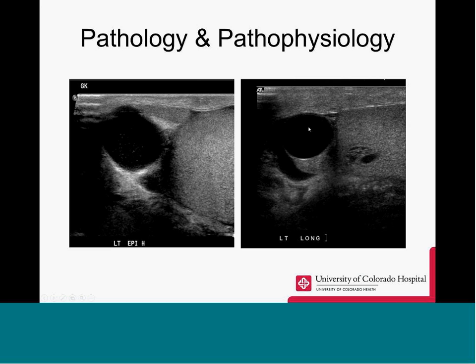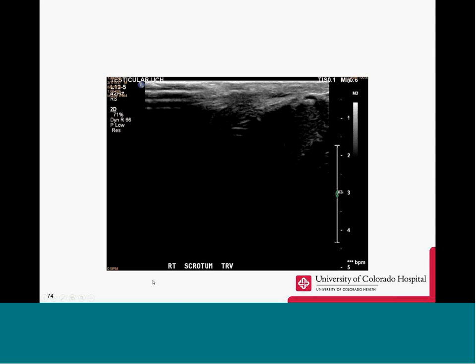Here on the right, it is more simple. Being within the epididymal head, we would still probably term it a spermatocele, but like I said, differentiation is not important. Another cine that does not work, I'm sorry.